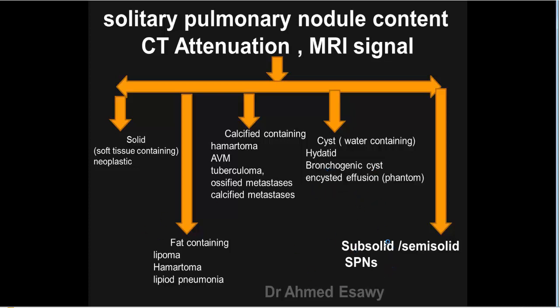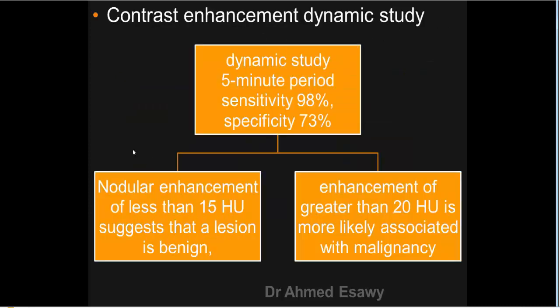Subsolid or semi-solid solitary pulmonary nodule. According to attenuation and content, nodules are divided into solid, fat containing, calcified, cyst or water containing, and subsolid or semi-solid solitary pulmonary nodule.